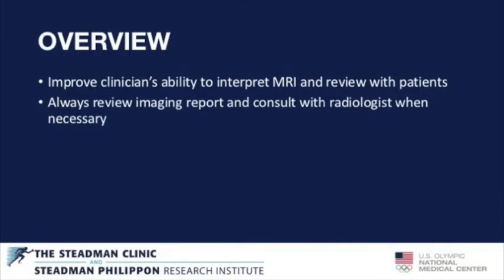This article and associated technique video are intended to improve the clinician's ability to interpret hip MR imaging as well as review the imaging with their patients. It is important to also review the interpreting radiologist's report, as well as consult with the radiologist with any questions or uncertain findings.